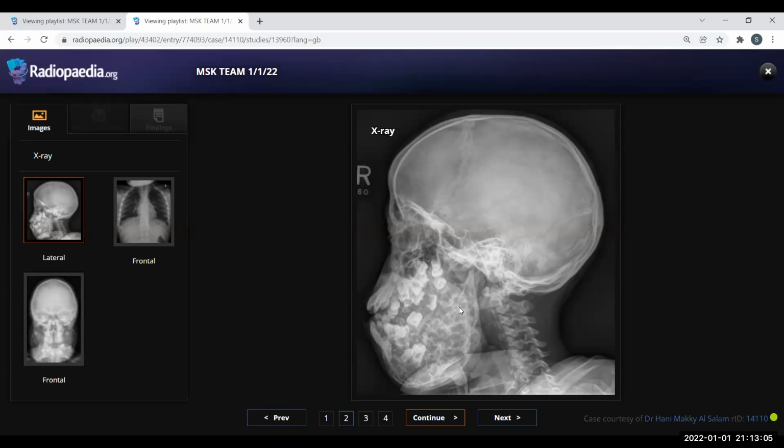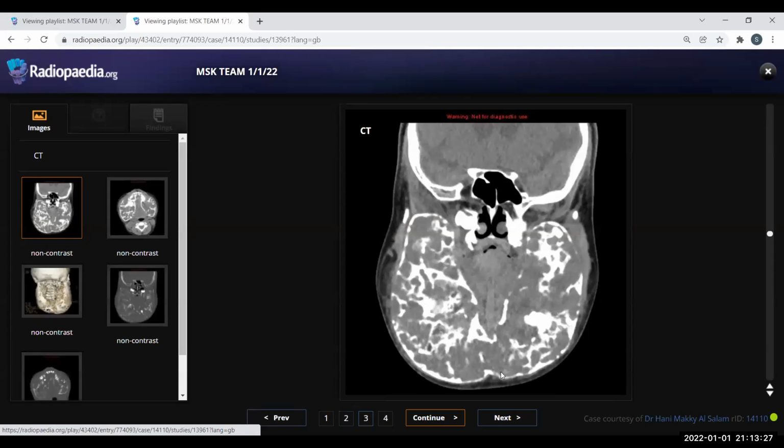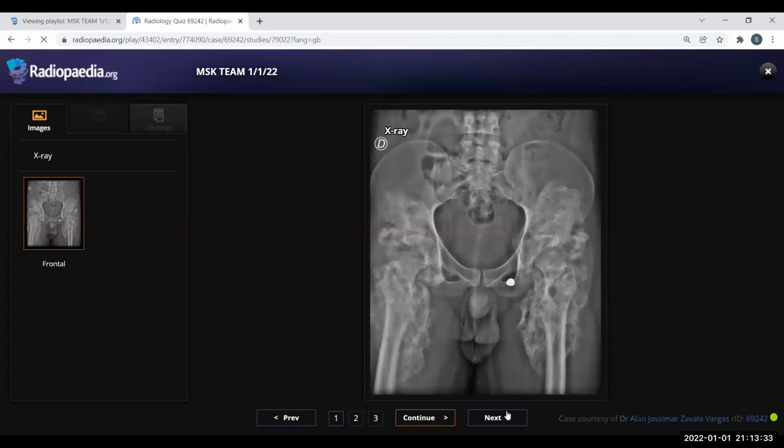So what is your diagnosis? So my diagnosis here would be fibrous dysplasia, cherubism. Sorry, what did you say? Fibrous dysplasia. So cherubism. Cherubism. Okay. Can you check number 3? I think it's CT. Okay, leave the CT. Let's go to the next one. You have already described it. Well done. We've got 30 seconds. Go to the next case.